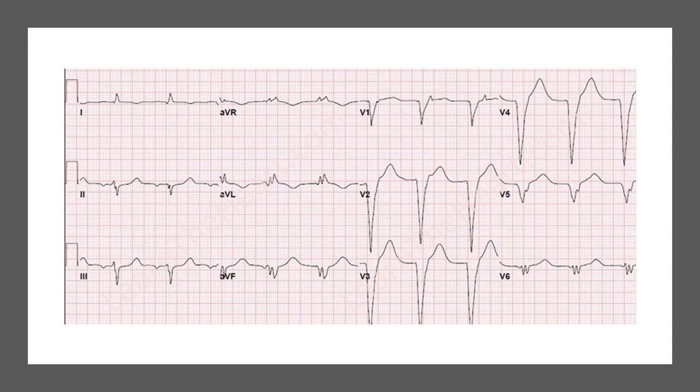And so in V1, we note a downward QRS. It's negative, it's wide, not quite the presentation we've been looking at in previous ones, but you note wide, deep S waves in the precordials. You look at V6, and it doesn't come back. All of the precordials, in fact, are negative. So you do have a notching pattern in V6, but it's negative. It should be upright to be a left bundle. So this isn't a left bundle.